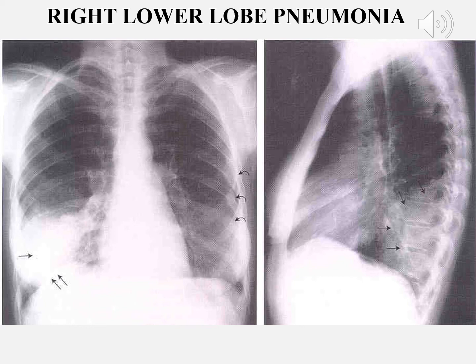If you look at this image, likely a female patient with some breast tissue. Look in the left lung, how it's a little hazy in front of the breast tissue as compared to the upper lung zones that are more clear and black appearing. So that sort of helps you. But look at the lateral view. Okay, so this patient has some breast tissue.